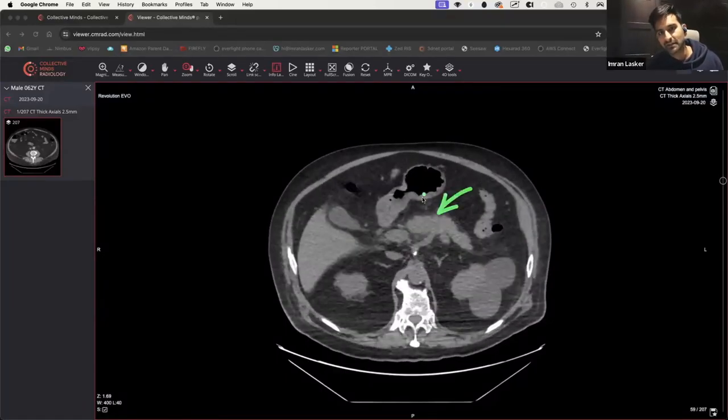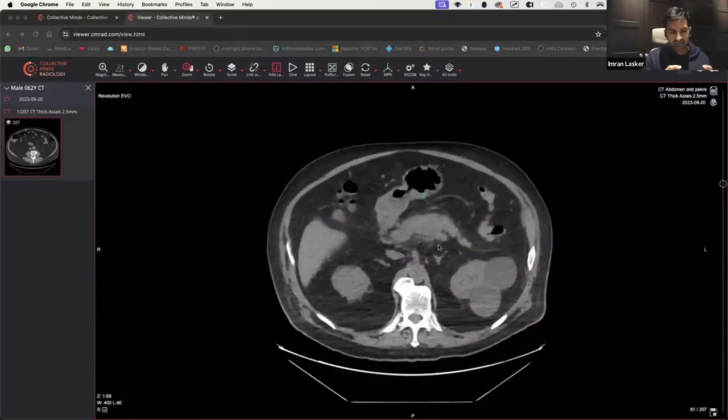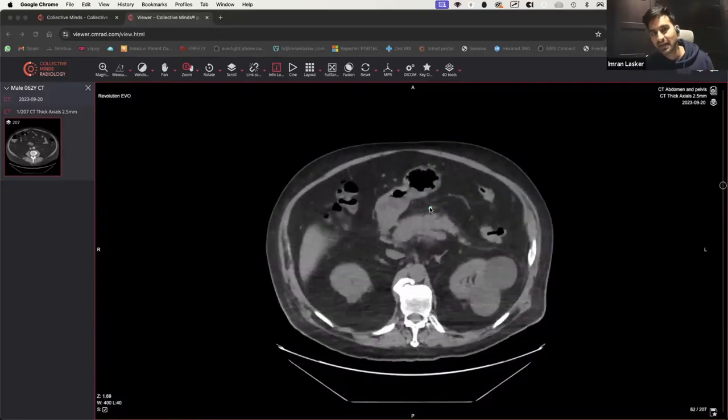But around this middle area, can you see that? It starts to look a little bit, very, very slightly fat. Okay? It looks very slightly fat. And around it, there's a lot of fat stranding. Like if you look at the fat over here, so let's do that.